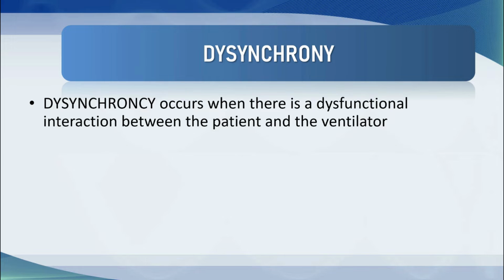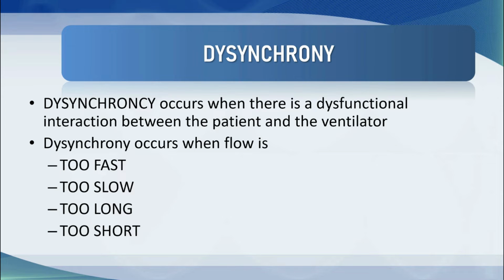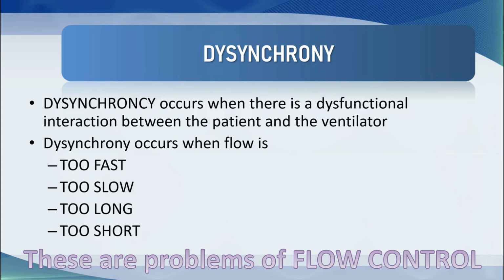Dyssynchrony occurs where there is dysfunctional interaction specifically between the patient and the ventilator. It occurs when flow is too fast, too slow, too long, or too short. And this is a problem of flow control. I will cover this in detail in a subsequent tutorial.